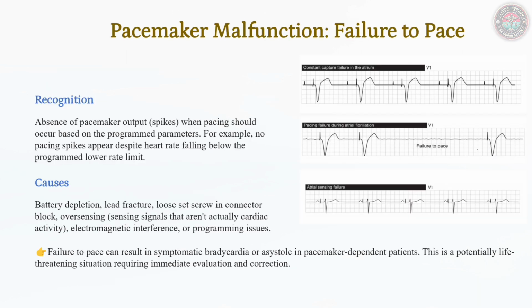Pacemaker malfunctions. Failure to pace. In failure to pace, the pacemaker does not deliver output despite the absence of intrinsic cardiac activity. This can result in prolonged pauses or complete asystole in pacemaker-dependent individuals.